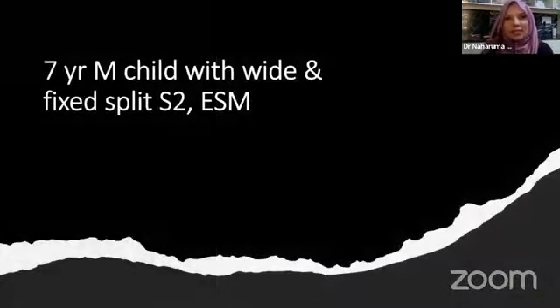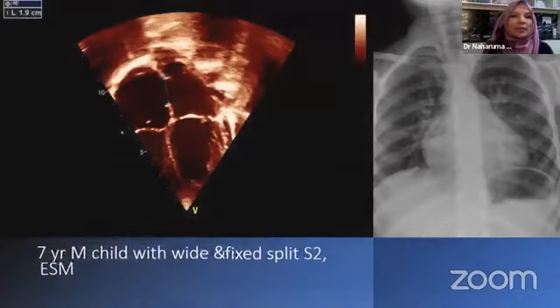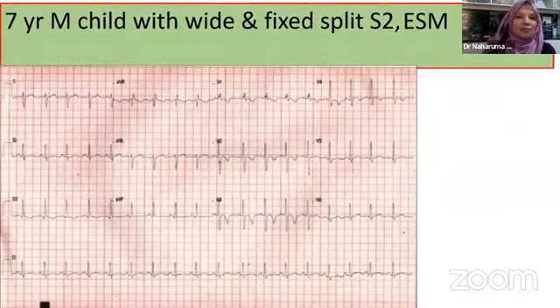So I am starting with a scenario: a 7-year-old male child with wide and fixed splitting of the second heart sound having an ejection systolic murmur. This clinical feature tells us some story, and in echo we found there is a mid septal defect at the atrial level, and in X-ray there is right atrial enlargement and cardiomegaly with some form of increased pulmonary blood flow. So this is the ECG of this baby.